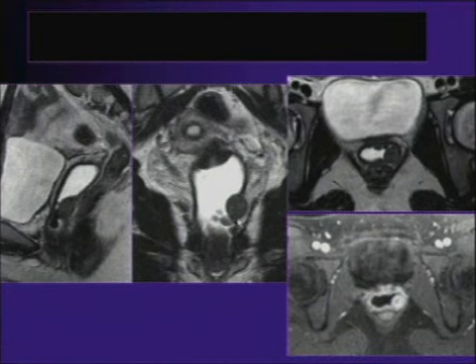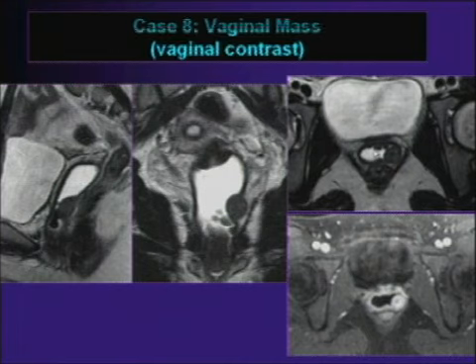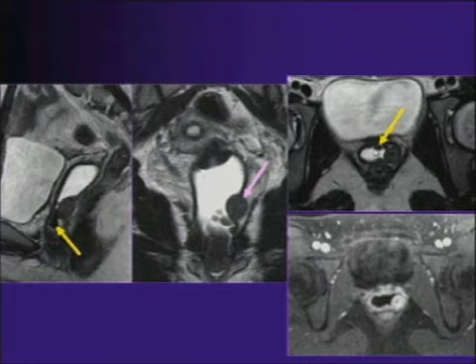You have to be a bit careful in these cases because you can introduce small air bubbles that should not be confused with filling defects within the vagina. And this is just an example.